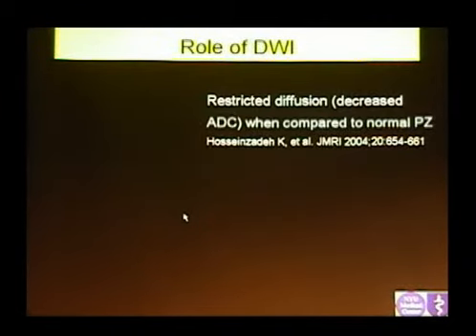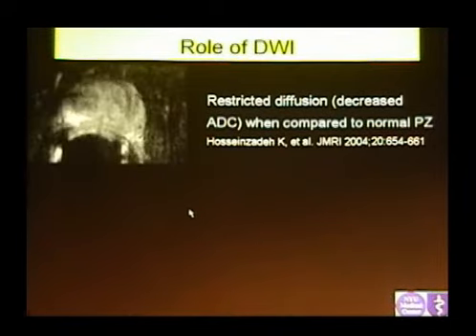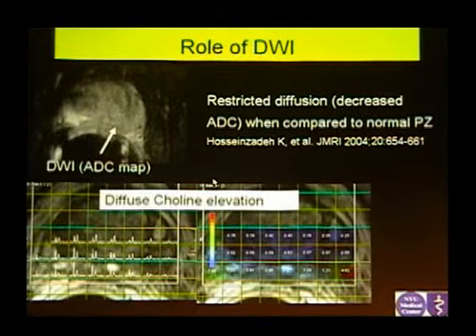So we've been using diffusion weighted imaging for the last months now. Again, this is a case I think I showed you already. Sorry, this is a repeat.